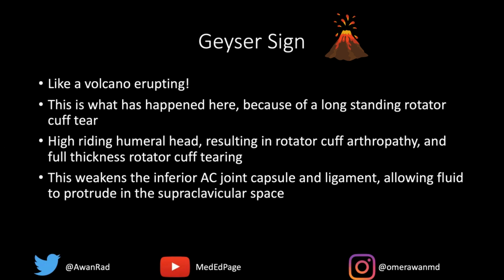A really cool sign. Hope you never forget it. If you see it again in the reading room or on an MSK MRI, think of a full thickness rotator cuff tear.